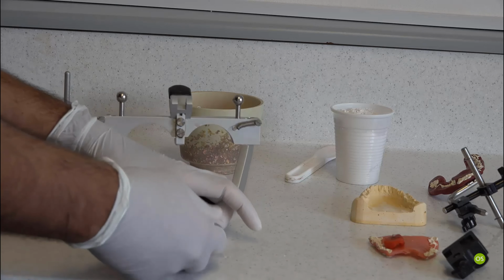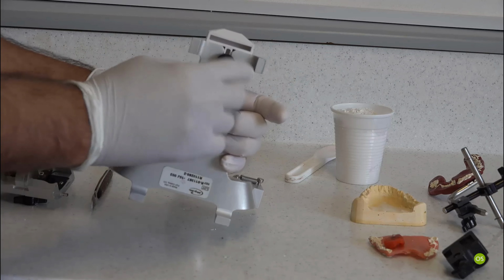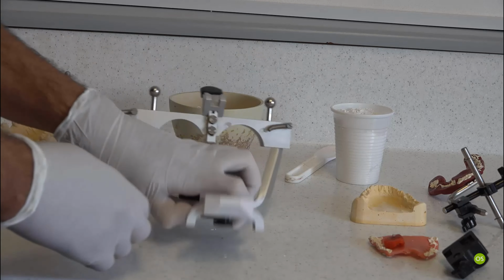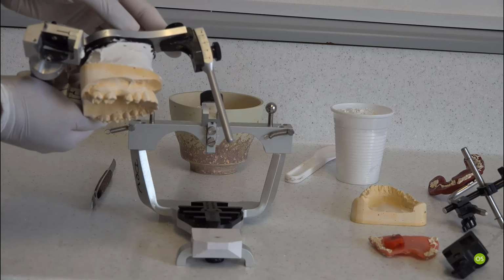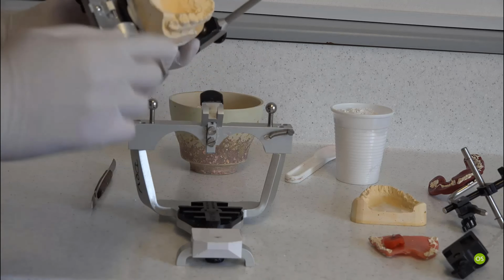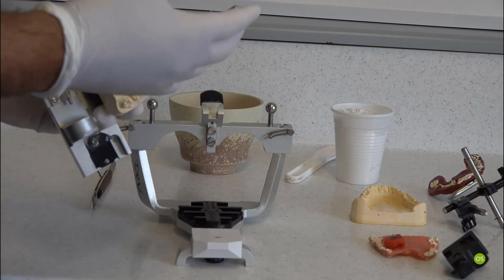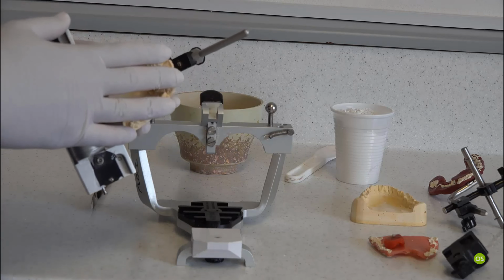Okay, so I'm just going to check whether it's fitting properly again on the side and on the bottom, and make sure it's nice and tight. I'll check again all the plates are nice and tight. I will also check whether it's at 0 and if there is anything shifted, all the angulation and alignment. Because this is a very crucial bit when we are now going to articulate the mandibular model to the maxillary model.